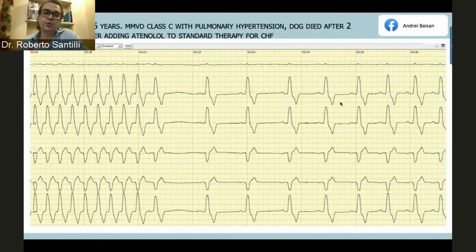So first of all, wide QRS complex? Ventricular. The second step is to look for AV association. If there is AV association, it is supraventricular. And then you look for anatomical bundle branch block or functional bundle branch block. So it's very important to move forward.